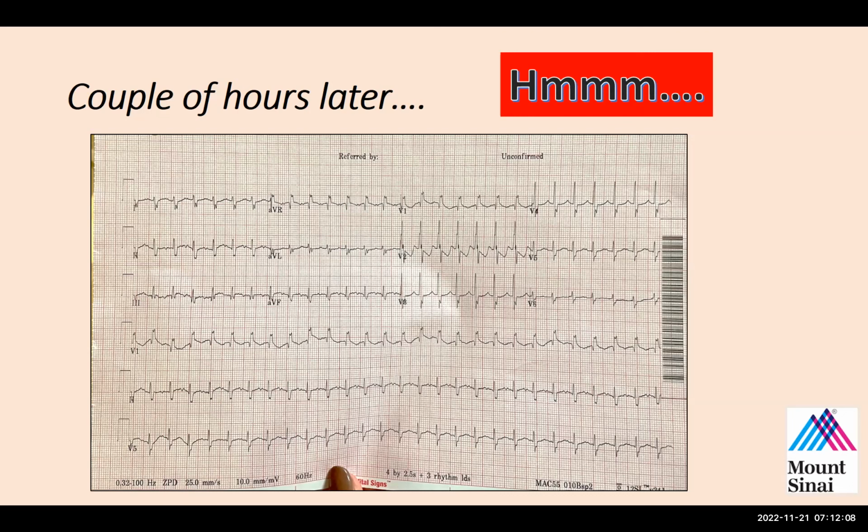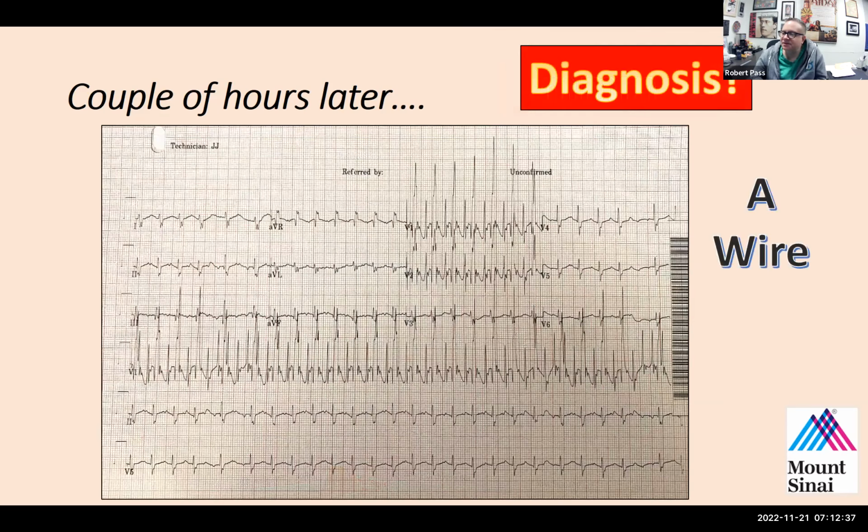I think that this could be atrial flutter probably, because I might see some flutter waves in, let's see, 3 and AVF. I would love to have another atrial electrogram. Okay, well, I'd be happy to provide one for you. So here it is. This was the atrial electrogram performed on that patient. So are you in continued agreement with this, or no?